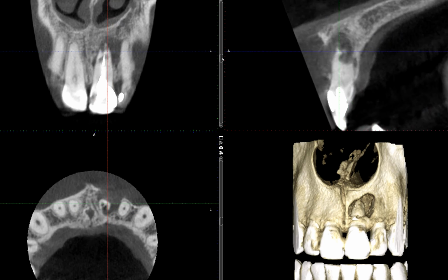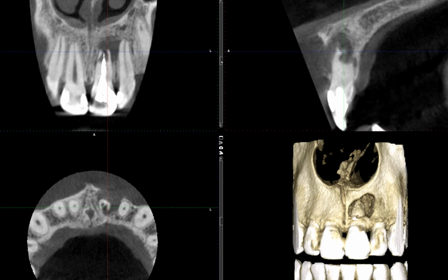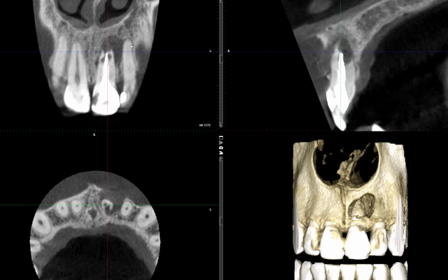Let's go ahead and take a look at the corrected coronal view. Besides the evidence of mesial caries, here again we see a well-defined radiolucency causing resorption of this tooth and extending distally to cause the resorption of the lamina dura on tooth number 10 as well. In terms of its superior extension, it's at least, I want to say, 2 millimeters, if not 3 millimeters, away from the floor of the nasal cavity.